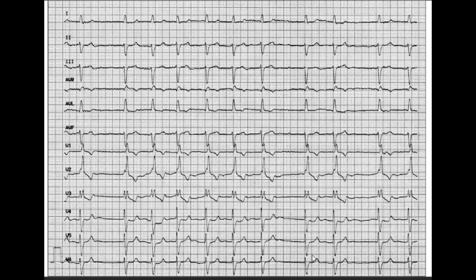You can see some biphasic T waves, I think here, quite biphasic, even here. Some discordant ones, I think in lead 2, and even in lead 3, discordant. So these ST and T wave changes, we just say disorder of repolarization. The QT interval is normal, it's 0.40. You can calculate this, for example, 0.40.